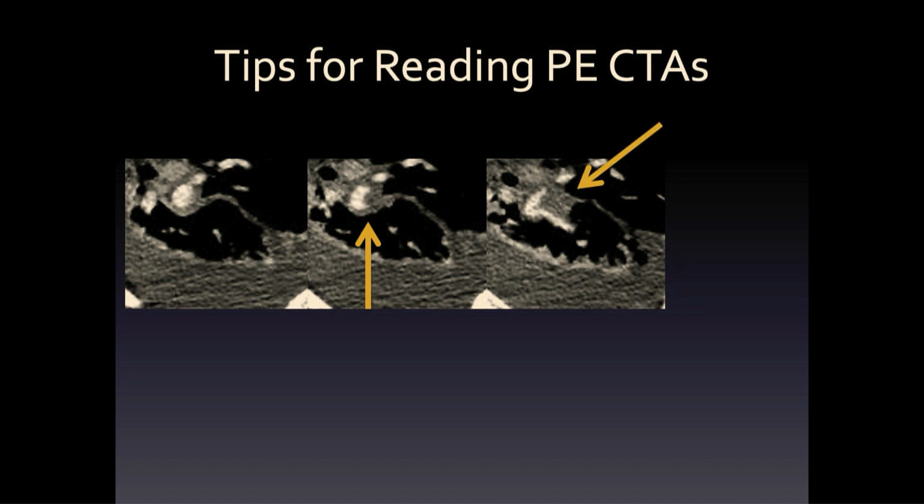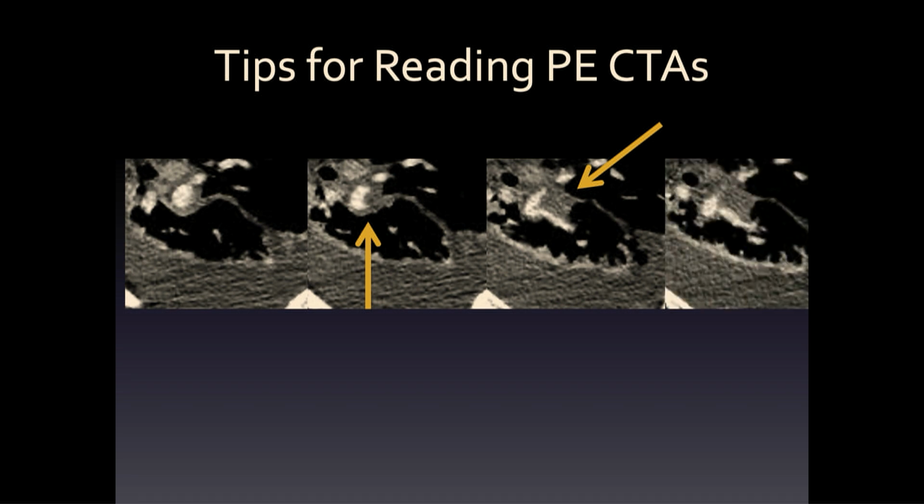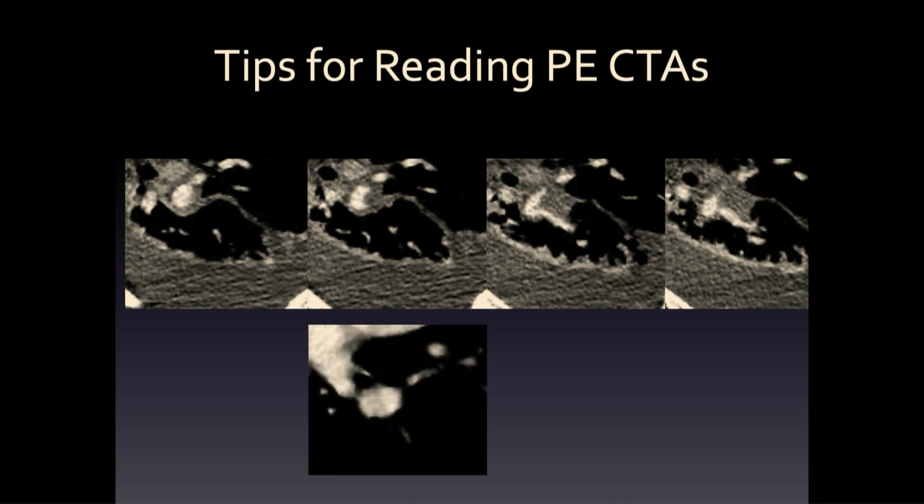But then is that fluid? Is it a lymph node? Is it a PE? And here it looks okay. So I did not like the rat bite, but I guess the rest looked fine. But this is the first time I was struck with, hey, how do I know what vessels are there? And the answer was, I found some prior. Any prior with contrast. And then I found out, yeah, there's supposed to be a medium-sized vessel there.